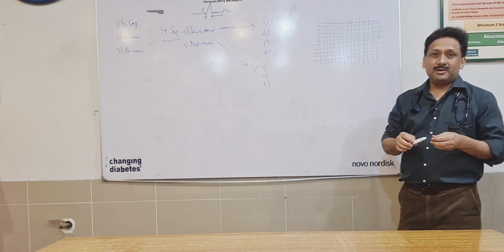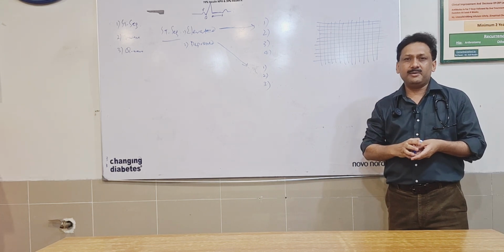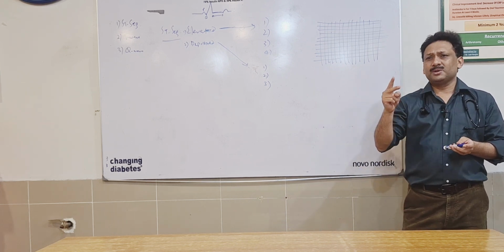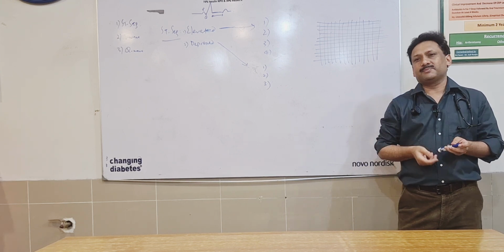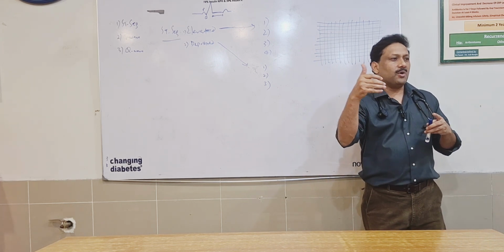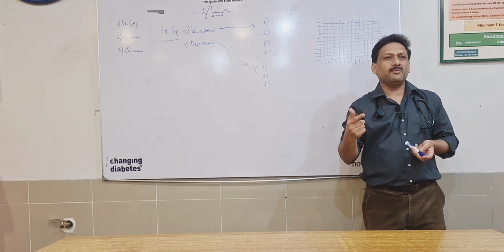When we declare that the ST segment is elevated, there are two important things. One, the elevation should be there in two adjacent leads. And when I speak the word lead, as we discussed in the previous session, different walls of the heart are represented by different leads, like the inferior wall.